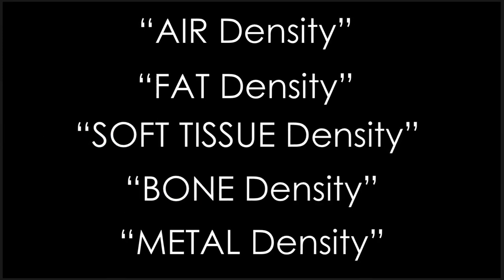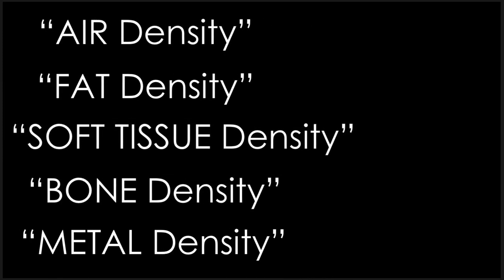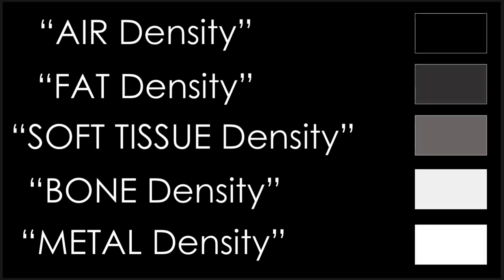Let us begin by taking a closer look at this word, pneumomediastinum. So, pneumo, meaning air, and I bring this up just to remind us about the appearance of air on a radiograph. As we discussed in several of the prior lectures, including the most introductory lectures, there are 5 fundamental densities, air being the black one.